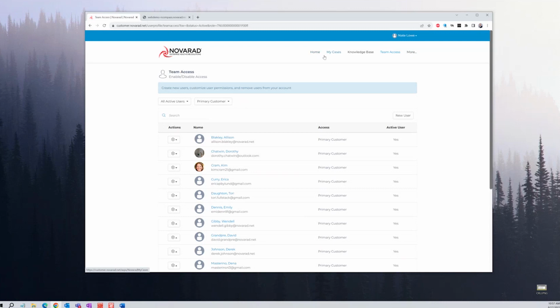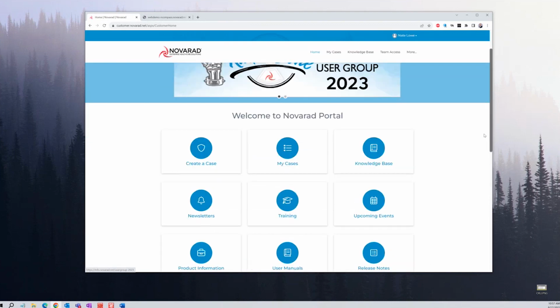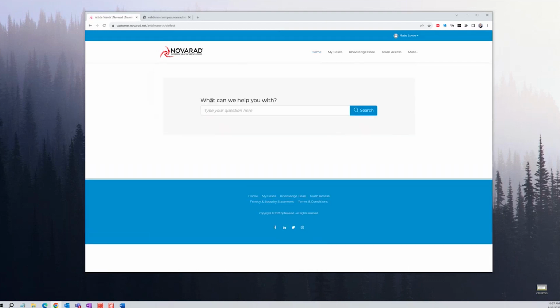You can get to the home page by either clicking home or the Novarad logo. So the first thing I want to talk about, aside from the team access, is creating a case. I'll click on that. What kind of a question or a problem or a request do you have? Go ahead and just type it in.